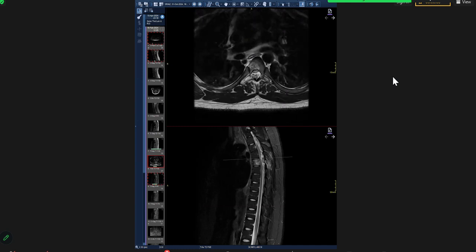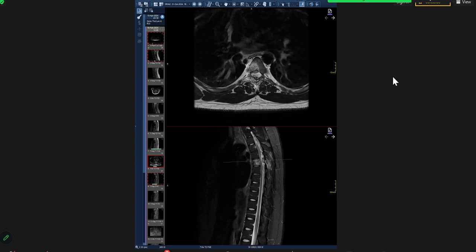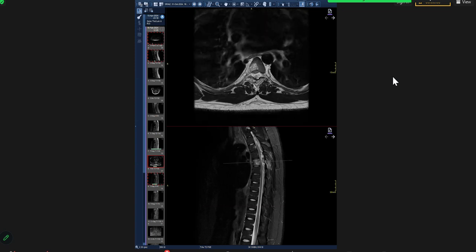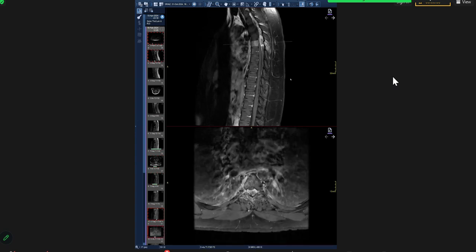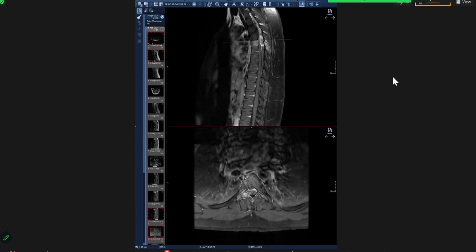Let me show you. So you see this, you see this, because this is the cord, right? The cord is markedly compressed anteriorly, and it's surgical. I would alert the neurosurgeon because it's an emergency. And this is the post-contrast image, so I'll scroll that for you.